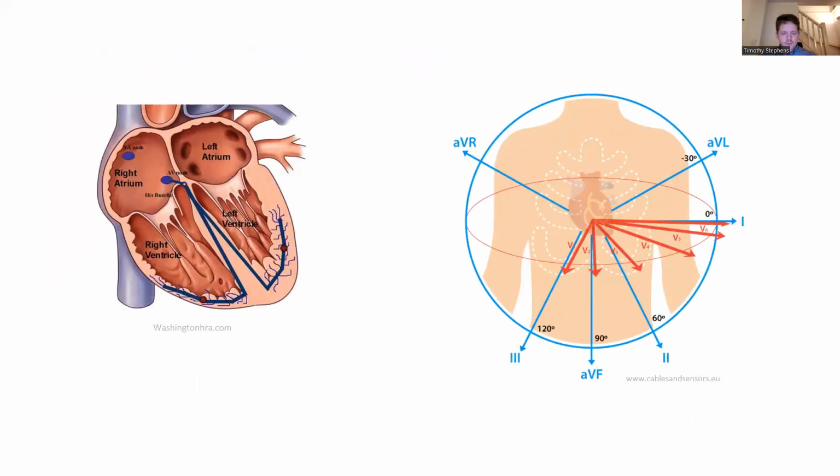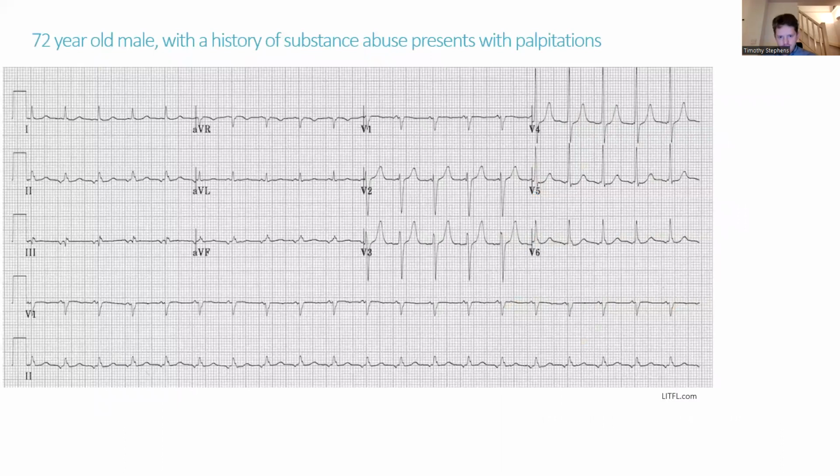So, right, our next one, this is the prompt for the next one. This is my next ECG. Dare I ask if anybody would like to have a go at interpreting this ECG? Go on, somebody be brave. I don't think we've got many takers, unfortunately. No, that's fine. Well, we'll carry on then. The main thing is the process here.